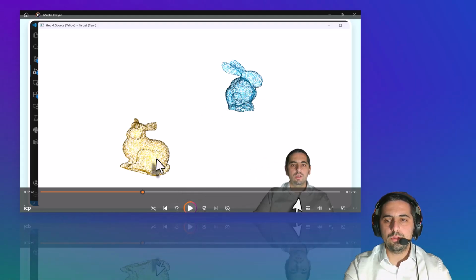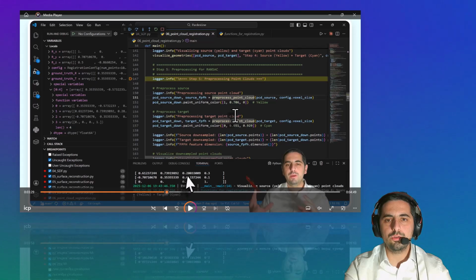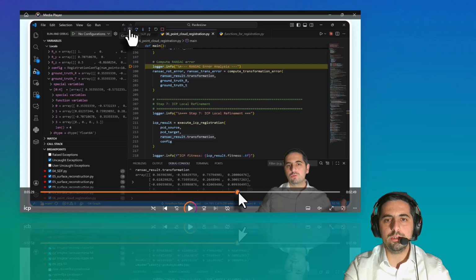So to do that, we can just remove the sound and try following that. You can see that we first need to get the features of the point cloud, and then use the ICP algorithm, and just go ahead with the video. Using the ICP, iterative closest point algorithm, we can get here the result, the 4x4 matrix.